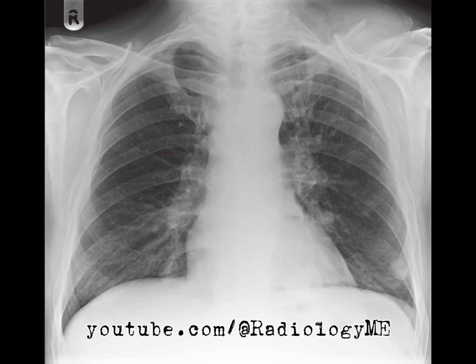Then the examiners might follow up with, what other benign conditions could present with clavicular destruction? This is where I'd say, it's true that benign conditions like hyperparathyroidism, rheumatoid arthritis, or pycnodysostosis could cause clavicular changes, but they'd usually have a different pattern, more systemic and not so focal. For instance, in hyperparathyroidism, I'd expect more generalized bony changes, not just isolated clavicular involvement. The aggressive focal nature of this lesion suggests a metastatic cause far more than any benign condition.